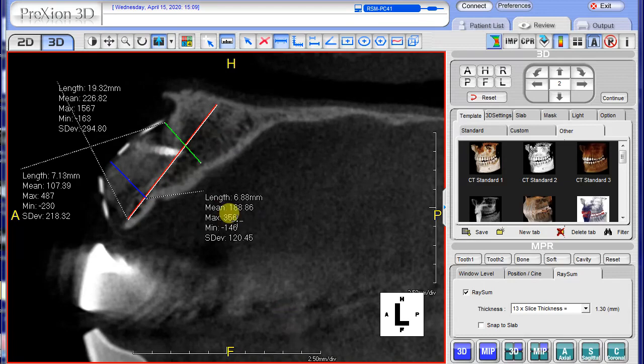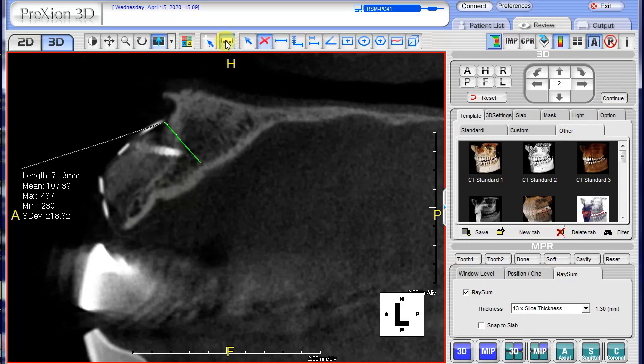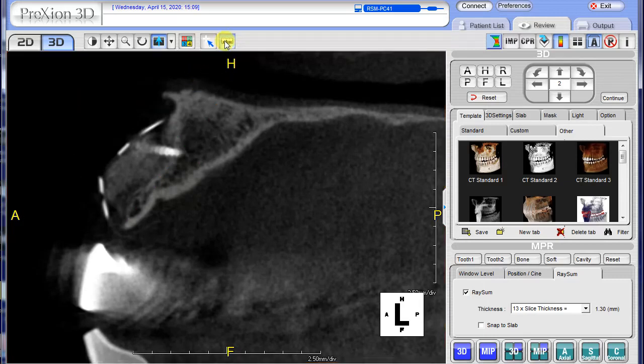To delete, right click on the number, delete, or you can click the little red X tab and delete, or hit the measurement icon, rule bar, and all the measurements will go away.